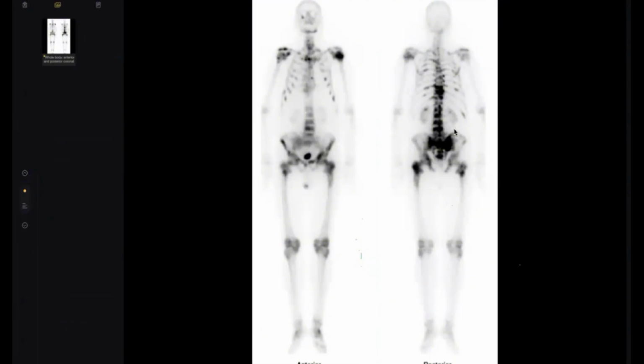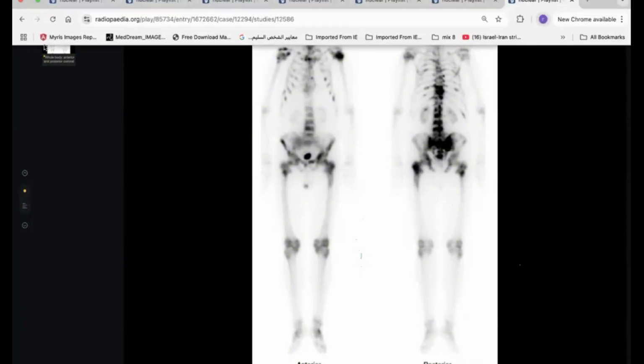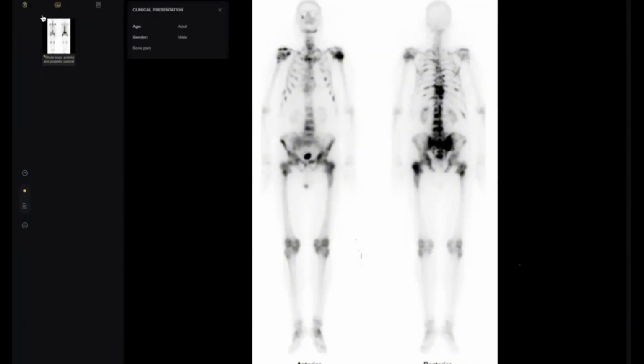Another reason is that you will not see all the cases like the book. My colleague asks, why do we diagnose this as prostate? Because he is a male. Really, this is the main cause. We didn't have a prostate ultrasound. We didn't have anything other than the history. This is the logical answer.